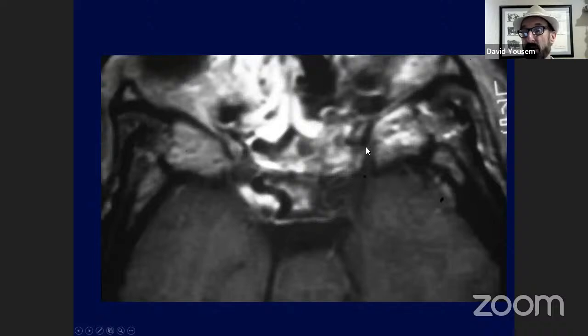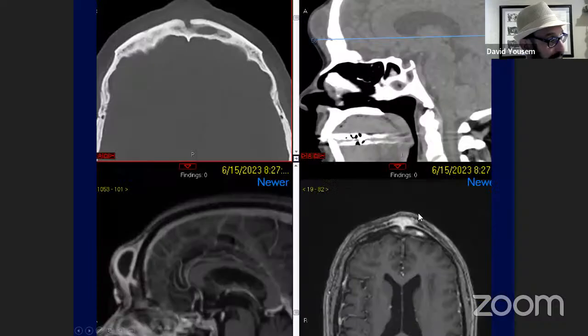This was one of the cases that I saw back when I was a resident, in which the patient had severe fungal invasive sinusitis with mucormycosis. And what you're seeing on this post-gadolinium T1 weighted scan is opacification of the right cavernous sinus, but absence of opacification in the left cavernous sinus. And if you look at the carotid artery here, faintly seen, it's narrower than the normal right side. It's got a little irregular margin. So this patient had fungal sinusitis with invasion of the cavernous sinus and thrombosis of the cavernous sinus associated with vasculitis. And the next scan showed MCA infarction secondary to the left internal carotid artery vasculitis from the invasive mucormycosis.